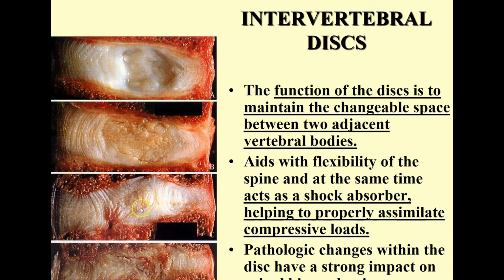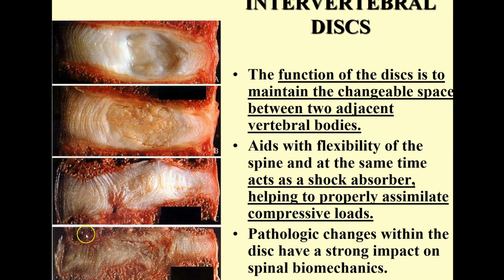Now we've got such a degree of dehydration that we really have lost the boundaries. We don't see where the margins of the container which holds the nucleus pulposus more or less in the center. And now we've seen down here in this final picture a tremendous amount of reduced density, disc spacing between the superior and inferior end plate, very irregular articular contours of these vertebral bodies, a very disorganized matrix where you can still see the outer layers are annulus fibrosis, but you also know this is where the space should be for the nucleus pulposus, and it's quite abnormal, quite intruded upon.